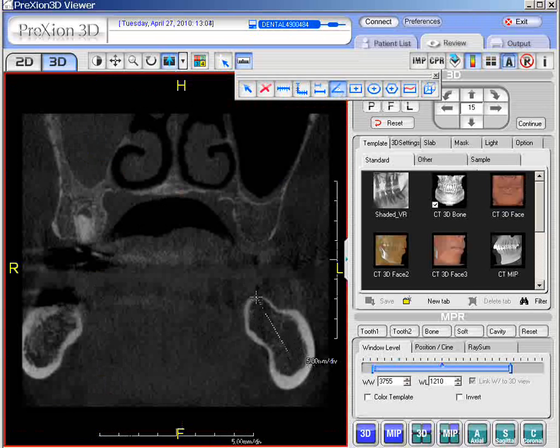We're going to left click it into position, and let's say for loading we want our actual implant, the abutment here, to come up a little bit at an angle. So you can measure that, and now you get an opportunity to see what the angle is between those locations if you wish. So you can plan accordingly. Of course, that would probably be a pretty steep angle, but one can again just make adjustments that way if you want to click on the boxes. Anyway, this is the angle measurement feature.